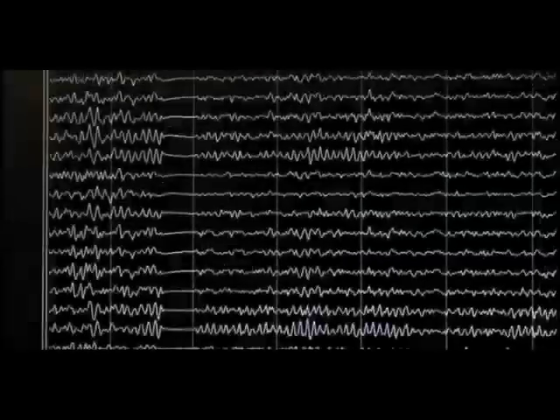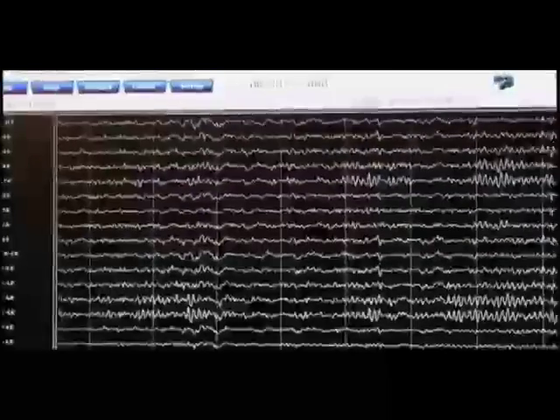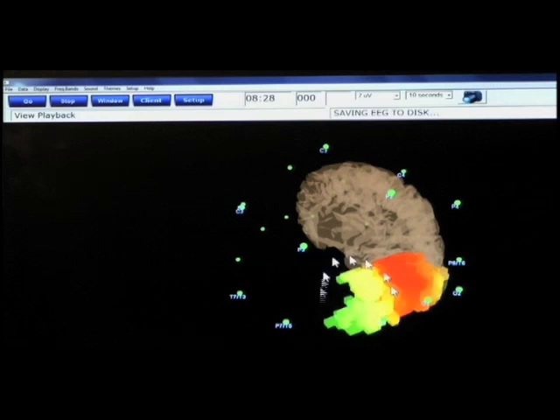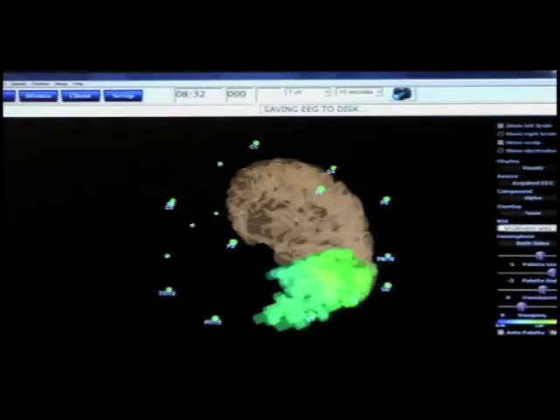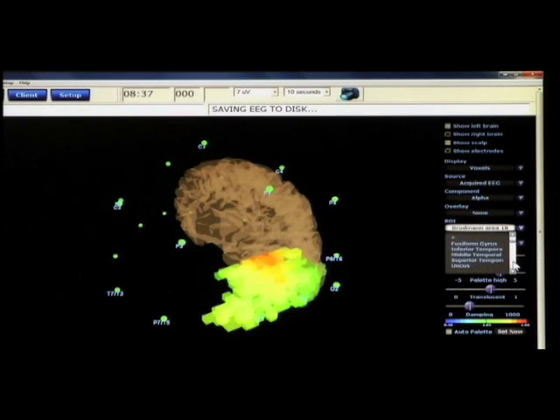To review, again, we have the full 19-channel EEG that we're looking at, and we can construct a live sLORETA projection like this, and this projection has, for all the voxels in a given region of interest, such as area 18, I could then show area 19, the activity of the voxels of interest.